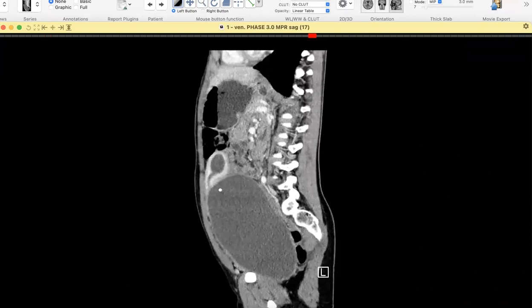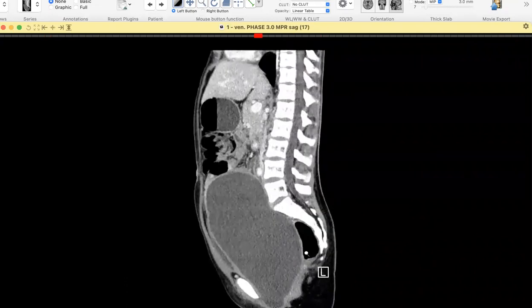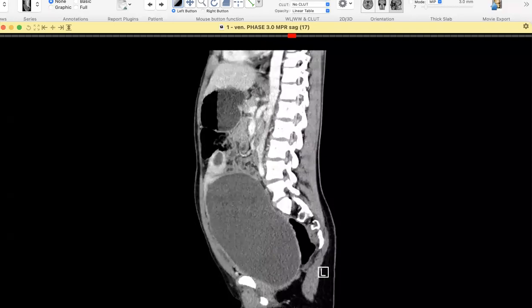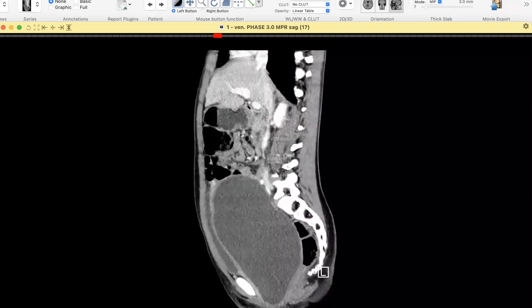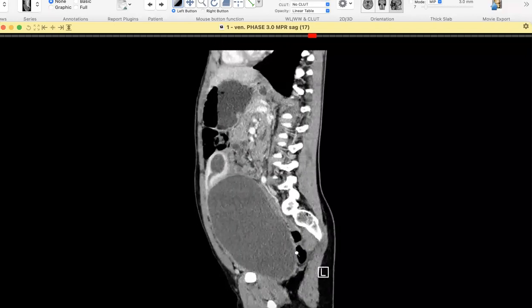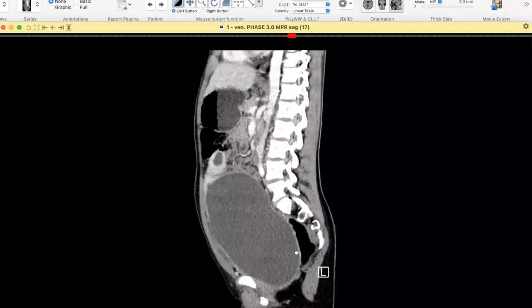So this is the uterus, right? This is the cervix. All of this is vagina. And the imperforate hymen is here. Good. So the patient had been complaining of pelvic pain for quite some time, and they were ignoring it until she developed some fever, because of which they brought her to the hospital.